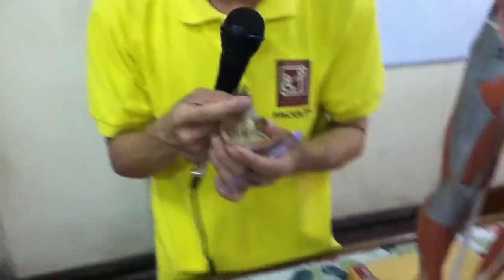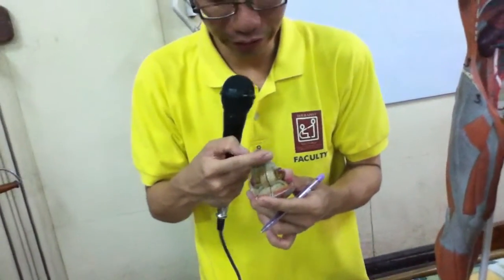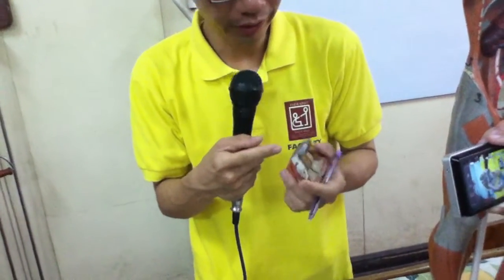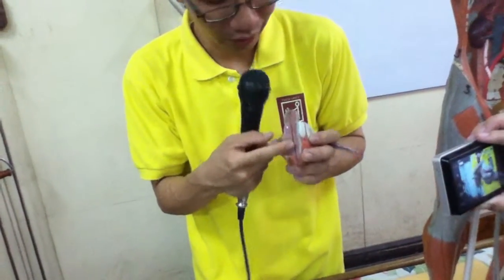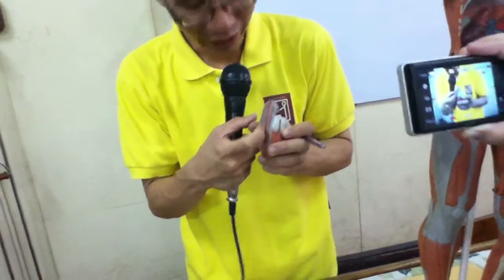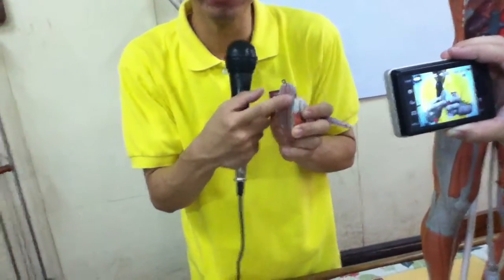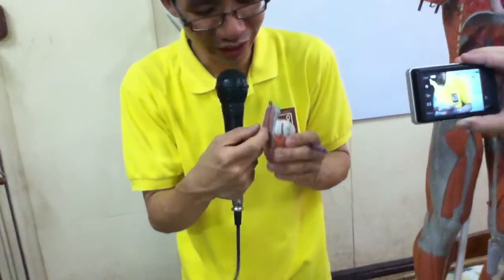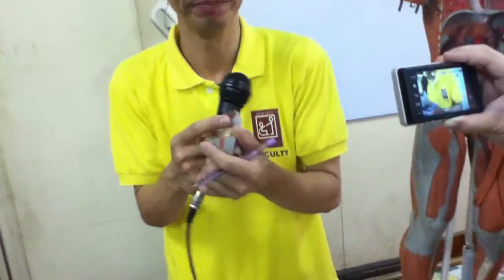So, this one is part of the rectum. Supposing further going down, you have your anal canal, which is not clear. And expected that you still have your anus. Again, it's not clear here. At least be aware of it. So, familiar na mo. So, your rectum, anal canal, and anus are not clear.